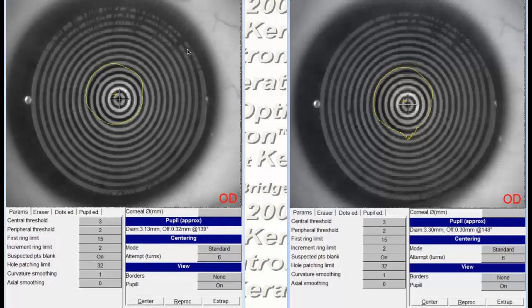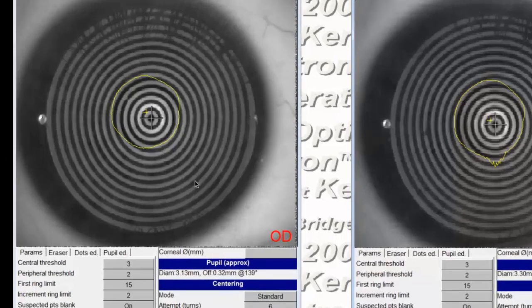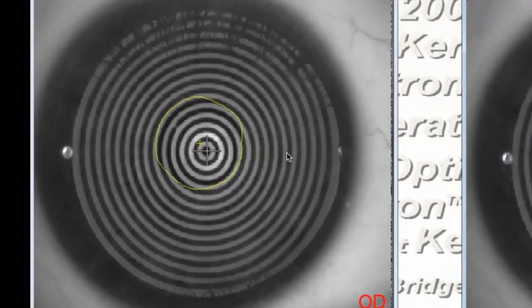So the better of the 2 maps is still here on the left side. I've opened up the next one, and again this one compared to the one on the left, just a little bit more rough around the edges, and so I'll close this one out. And I'll do this 1 against 1 process of elimination until I'm left remaining with my one best map. So assuming that we go with this map on the left, everything looks pretty good.